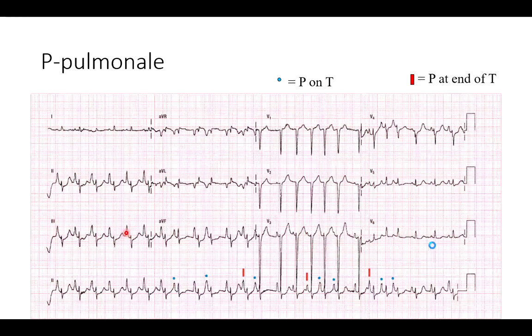These are huge P waves. Look at this. Might see some right ventricular or left ventricular hypertrophy in this one. A lot of different things are going on, and my eyes are scanning. This is why we get a lot of different confirmation from different areas.